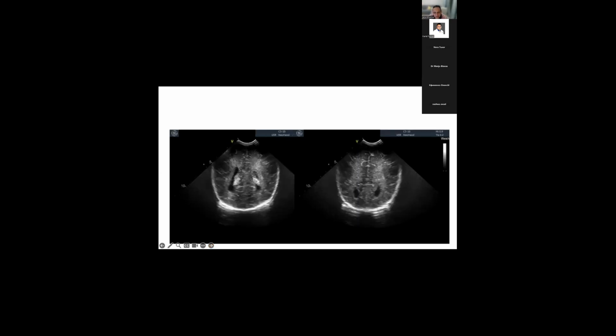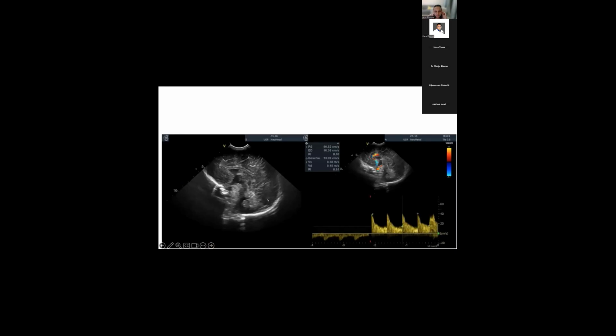Then in the posterior regions, the posterior horns of the lateral ventricles and the choroids. Because you have ventriculomegaly, the posterior horns are a little bit dilated. In the midline, the corpus callosum was complete. You can see the fourth ventricle, and again a really big cisterna magna, because you have ventricular dilatation, so you have a dilated extra-axial space.